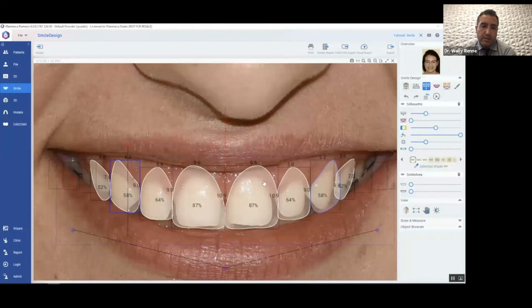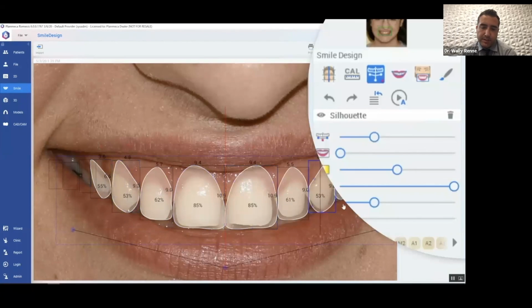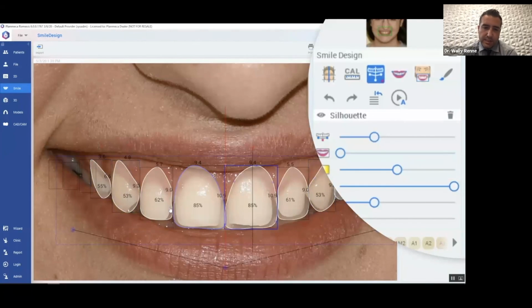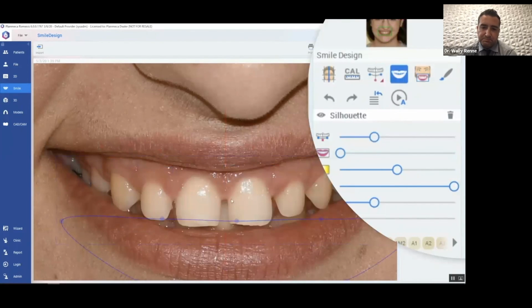Okay, so now here we are manipulating those silhouettes. A little bit sped up here for you guys because I don't want to run out of time. I want to show you everything that I want to show you today. And barely touching the wet-dry line of the lower lip. Try not to lengthen too much incisally. Lengthening on the laterals a decent amount there.